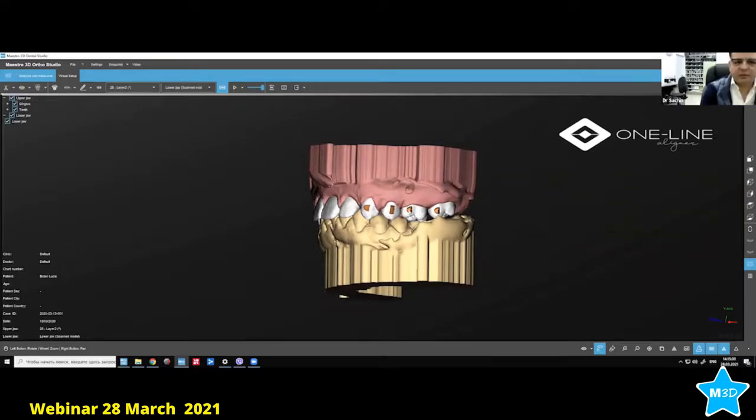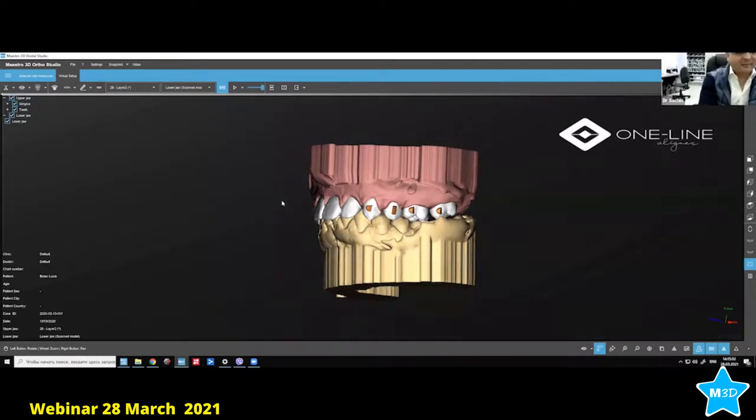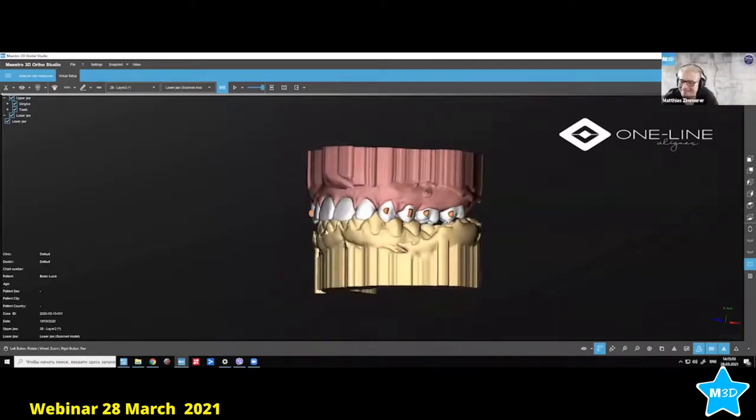Then I changed it over to a rectangular beveled vertical with mesial tip of the roots, and then I just corrected the position. So this is what we should not be doing. This is one of my mistakes which I made in the beginning. It is an old case. Without mistakes, you can't learn. Yeah, of course.